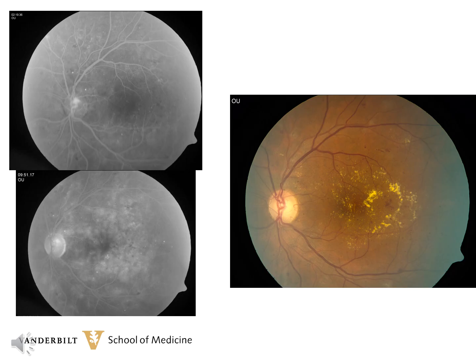This is a case of diffuse diabetic macular edema. You can see from the clinical photograph there's severe hard exudates with a circinate pattern temporally. In the classic pattern of leakage, there's minimal hyperfluorescence in the early angiogram. But as the angiogram progresses, as more dye leaks out of the retinal capillaries, it will stain the interstitial tissue, and you can see that as the hyperfluorescence throughout the macula in this particular case.